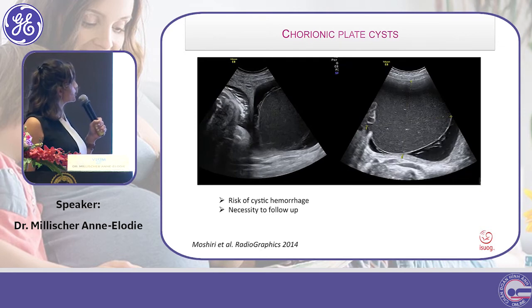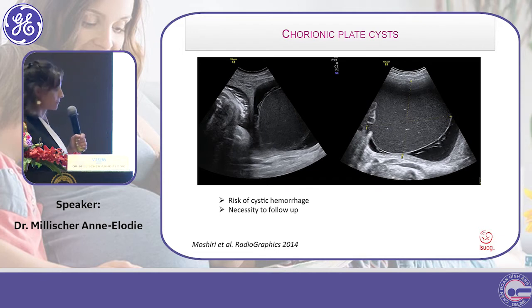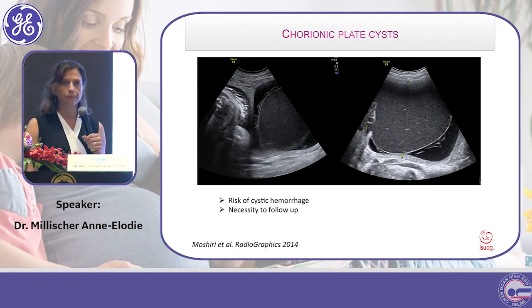Sometimes it occurs like that, a very impressive cyst due to hemorrhage inside the cyst. Đôi khi các bạn sẽ thấy những cái nang rất là lớn và nó có những cái phản âm lợn cợn bên trong, thì đây là do có xuất huyết ở bên trong nang.